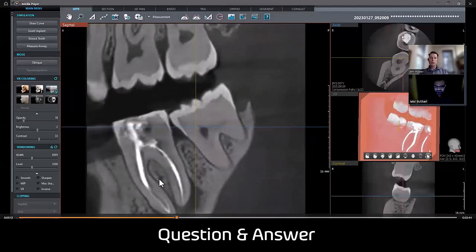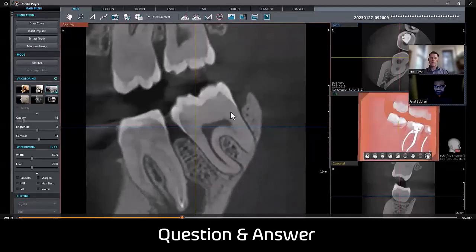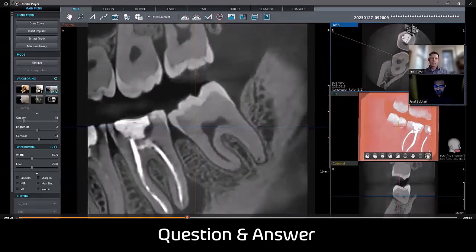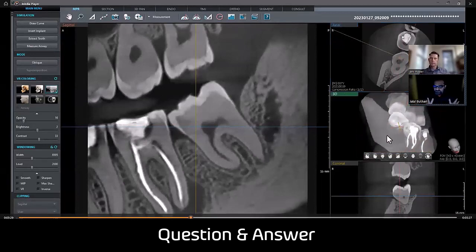But as we scroll across and we make those changes, we'll be able to really see what we're trying to further enhance or focus on. So let's give this a playthrough right here. Now we're rotating that line, and now we can see more of that anatomy that we talked about. Absolutely. Look how clear it is.